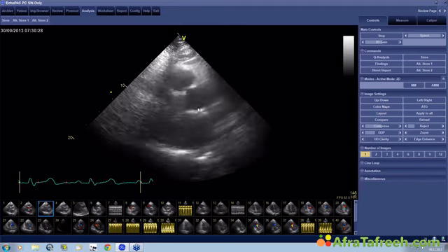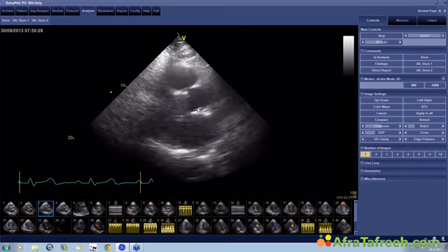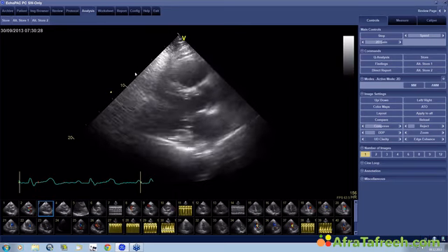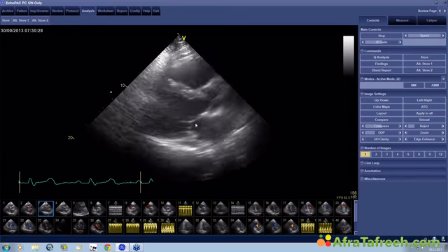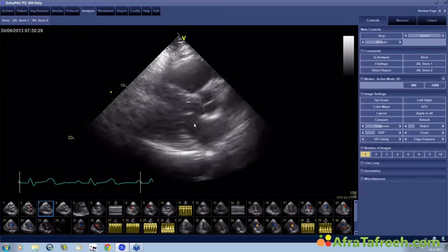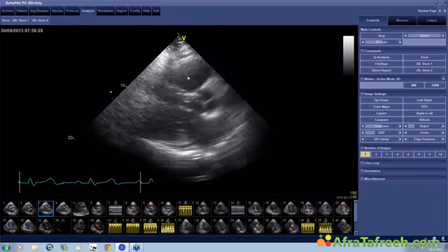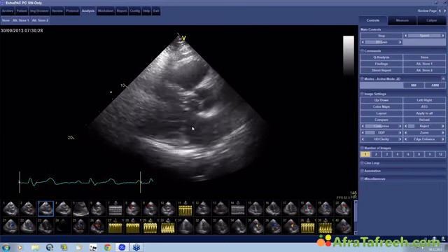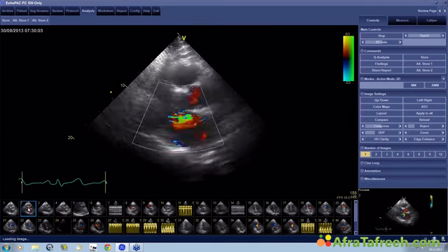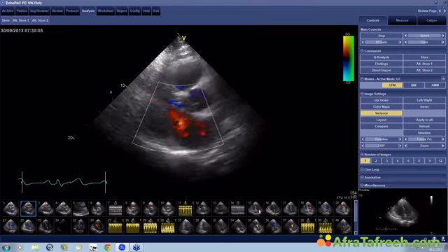This is a patient who came to our lab with image quality which is not really very good, as you can clearly see here. This is a parasternal long axis view. I don't know if you see what the pathology here is. Very difficult to see. Focus on the mitral valve. You have the impression that there's a prolapse here, and when we turn on the color, truly there is some degree of mitral regurgitation, where it's quite difficult to say in which direction the jet really goes.